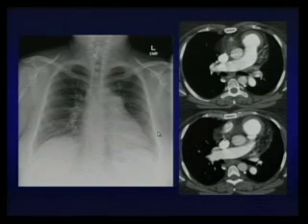If you see that the pulmonary arteries are converging toward the lateral side of that mass, it represents a prominent pulmonary artery. If the vessels are going through the mass and ending behind the mass, that mass is not a prominent pulmonary artery and could be a mass in the hilum.